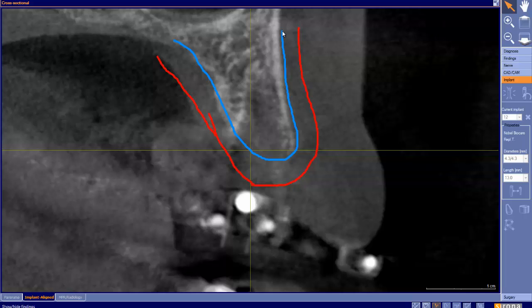The other thing we can take a look at here is where the tooth socket was, just like so. This is important sometimes, depending on when the tooth was taken out and if it was grafted. We know we're going to have the most dense bone there based on the graft material we may have used, or if the tooth was just taken out 6 to 8 weeks ago and we're doing a delayed immediate placement, that will be not so stable bone because it hasn't fully filled in yet.